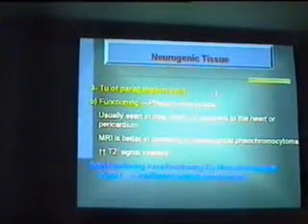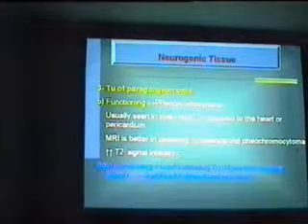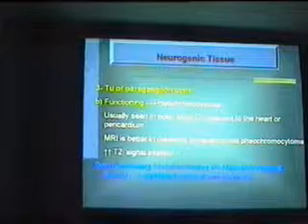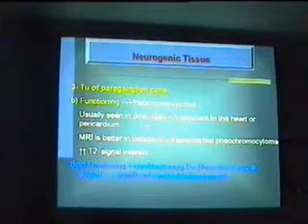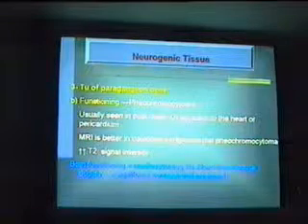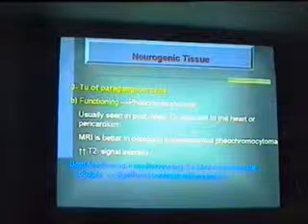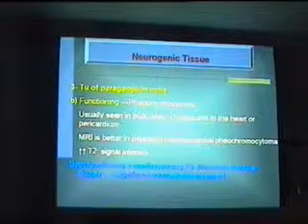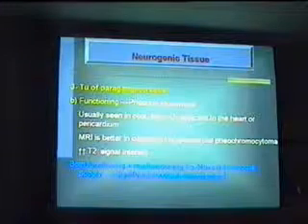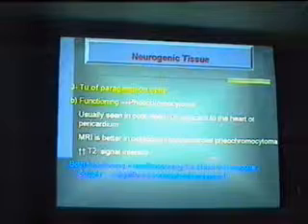أو functioning اللي هو الـ pheochromocytoma. طبعا لو لقيت الماس دي ومعها bouts of hypertension فالتشخيص هنا يمكن يبقى أسهل. Usually seen in the posterior mediastinum or adjacent to the heart or pericardium. MR is better in detecting the intrapericardial. انتوا عارفين إن الـ pheochromocytoma تحب تروح جوه الـ pericardium، sometimes تبقى located في البلادر، ectopic sites كده للـ pheochromocytoma.